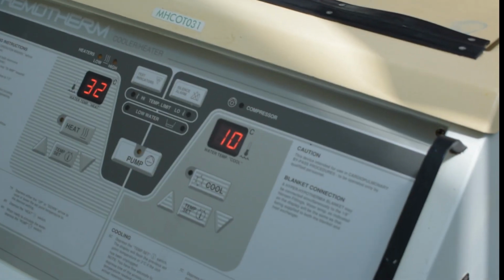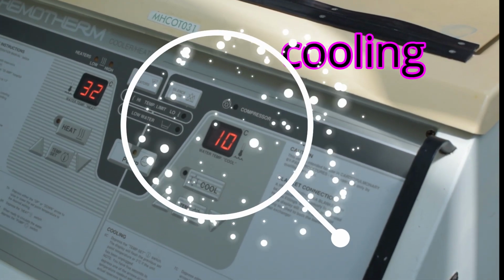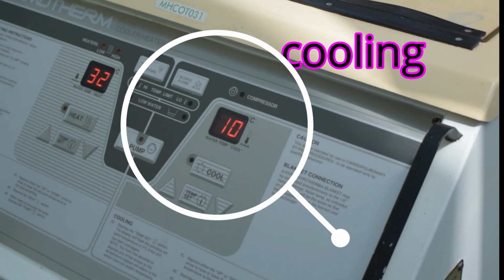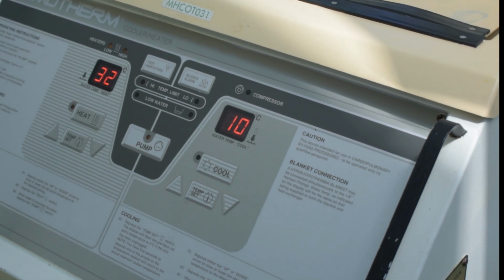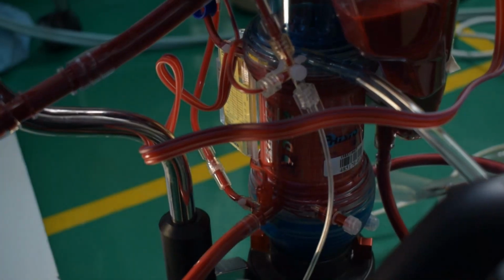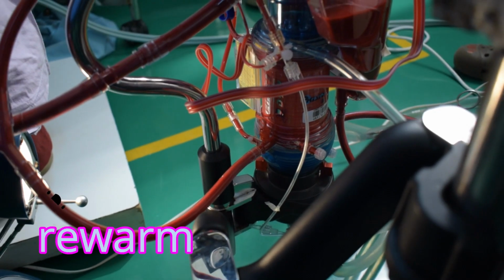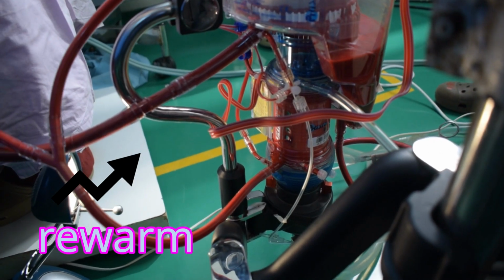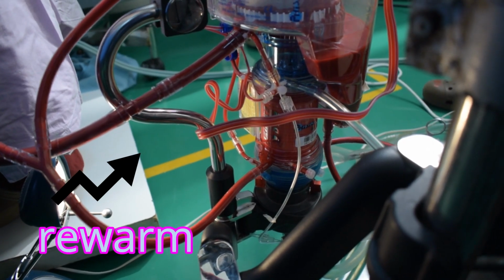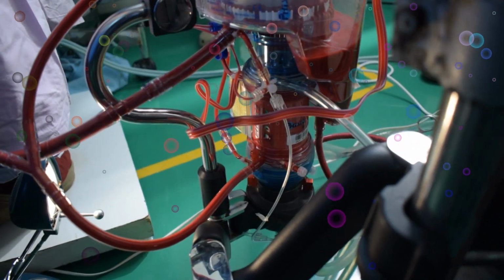Now, rapid cooling is commonly used at the onset of cardiopulmonary bypass when circulating water is cooled to temperatures approaching 3 to 4 degrees by an ice bath, thus rapidly cooling the blood. At the conclusion of cardiopulmonary bypass, the rate of rewarming is limited by concerns regarding blood damage due to overheating and bubble formation because of the lower gas solubility of warmer blood.